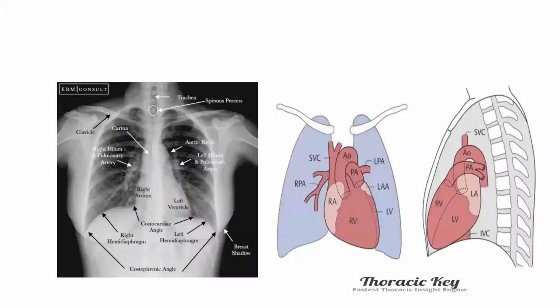If I just take you back here, we said that this border, the left border here, is the aortic knuckle. The pulmonary artery comes here. The LA appendage comes somewhere here, and the LV. Okay? So if you see a bulge coming here, because you are not seeing the structure, you are guessing by their common location, you are more likely to think of it as what?